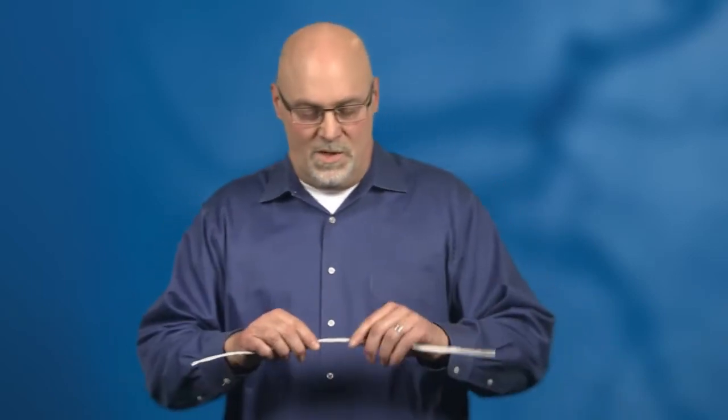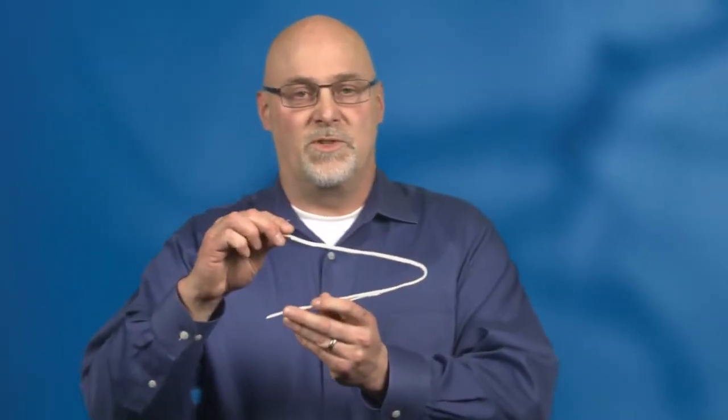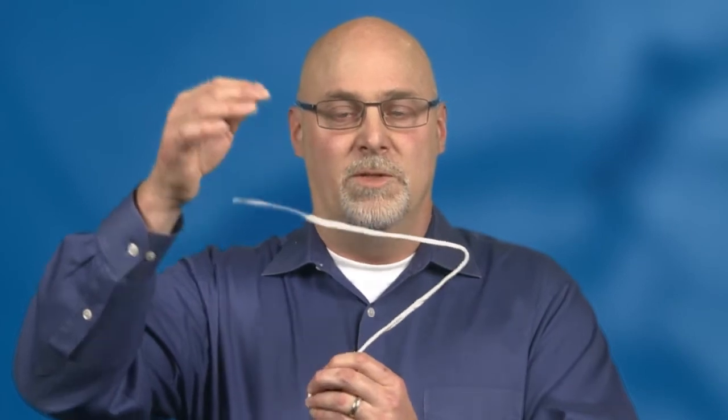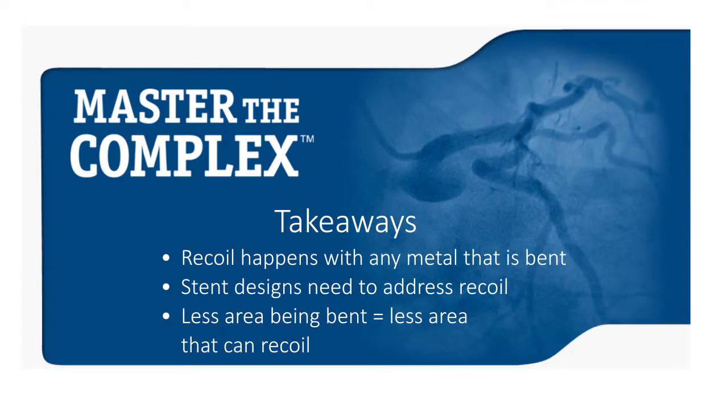To give you an example of that, again with this wire, we'll just make a simple strut. And again, when I expand it with the balloon catheter, deflate the balloon, it snaps back, recoil, right? Because we're bending throughout the entire peak. Where with Synergy, if we focus our bending adjacent to the peak, we balloon it open, deflate the balloon, it does not recoil as much. So this is one of the advantages of the Synergy design. It has lower recoil than most other stent designs.